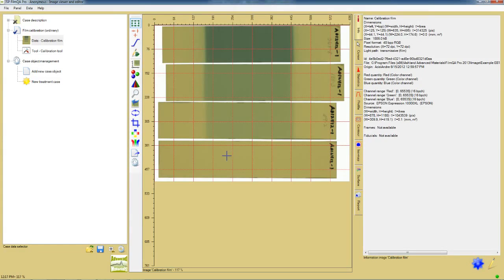Because Film QA Pro uses rational asymptotic fitting functions that behave like film, that is, the responses approach constant values at high dose, just as the darkening of the film gets progressively smaller with each dose increment, fewer data points are needed to correlate the specific response behavior of film to dose.